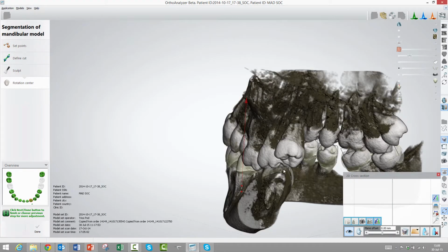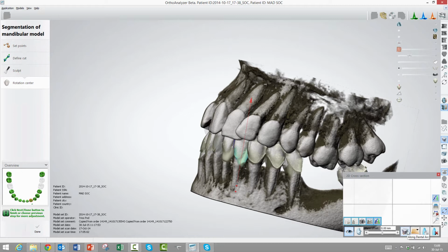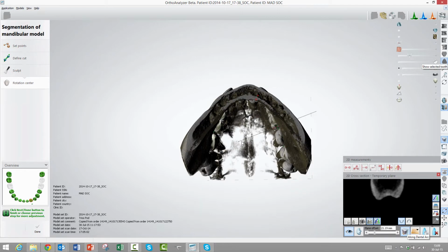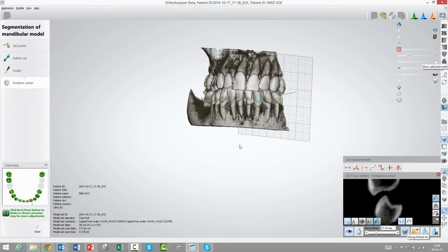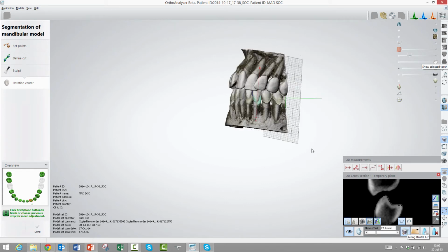I'm not going to save it. And we also have another possibility. Down here we have along the dental arc. If we activate it, I will just show you from a short view. This arc here will just go around the dental arc instead. So we have a different view. And exactly as before, you can go in and clip it and take a side view of the teeth in that direction.